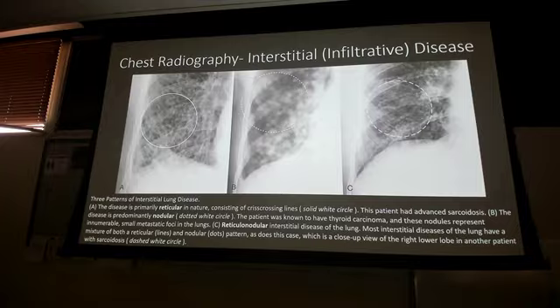No, you're not looking at a PA x-ray, and I would not want you to, nor should you, look at just a PA and look at a mass and be like, that's anterior mediastinum, for sure. Because without a lateral and some other information, you don't know for sure. Now, you can get all that info, and then 6 months later, after doing the full case study, like what's in Radiopaedia, come back and go, oh yeah, obviously, it's right there. So I wouldn't get so hung up on that. I want you to have both, because I showed you where those compartments were on the lateral chest x-ray, intentionally.